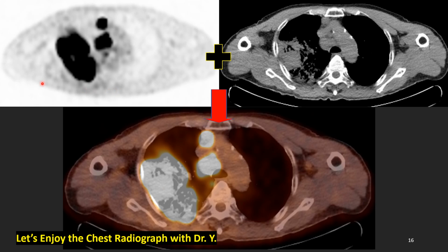On your left side, this axial tomographic image of a PET shows hot uptake as black, dark, thicker density here, lymph node. And this actual tomogram CT image shows consolidation of small cell lung cancer here and lymph node here and here as structure and anatomy. PET is function, shown here. Anatomy is shown here. How about the fusion of these two images, two studies?